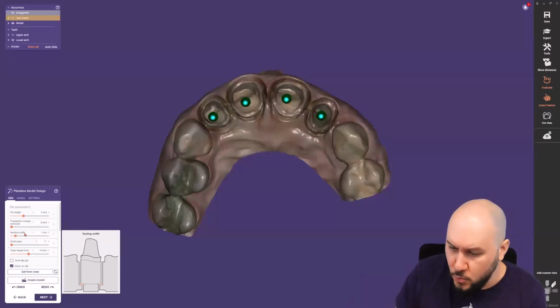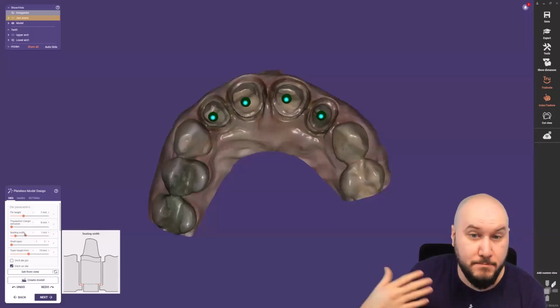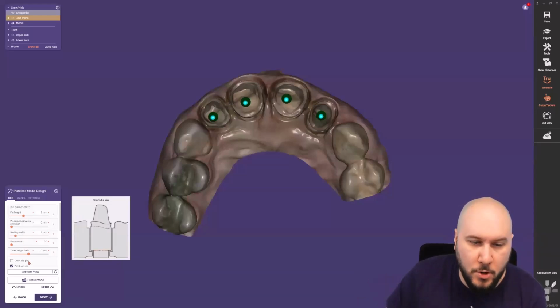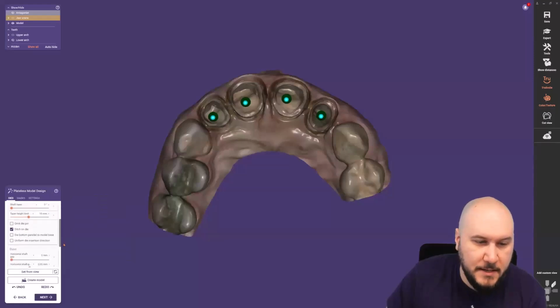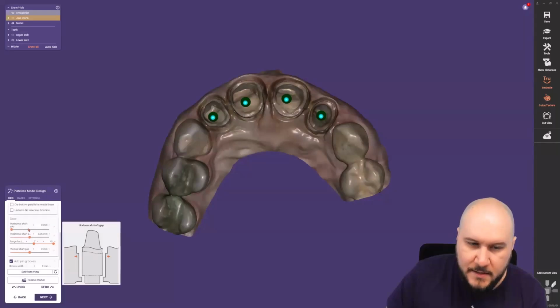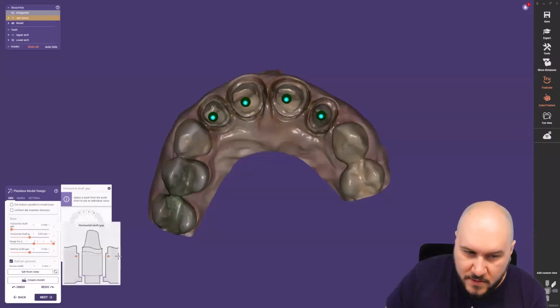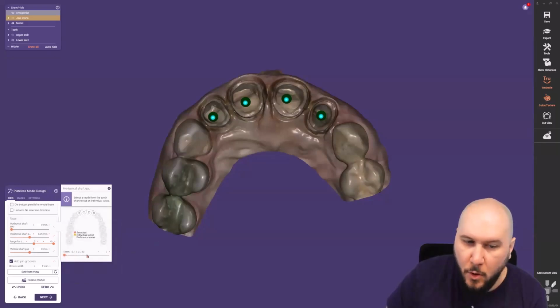This is not new in Elefsina, but I just mention it again, that there is a possibility here to work with different kinds of parameters, and so on. So we can see here that there is the possibility to set the shaft gap. But now we come to a point that's been there since our last version, but is sometimes forgotten. You can also see now that this horizontal shaft gap is applied to all the teeth at the same time.